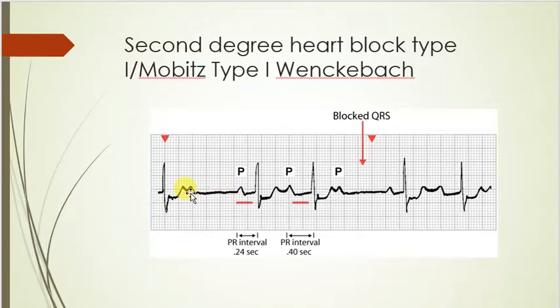Here's another one that occurred before, and then a QRS didn't follow. Typically this is a sign that something may be going to happen, especially if it's a new occurrence. We want to be monitoring them. We want to make sure that we are checking for drug toxicity. And if the overall heart rate is bradycardic and the patient is stable, we just observe them.